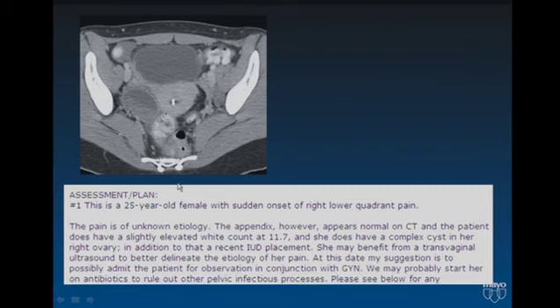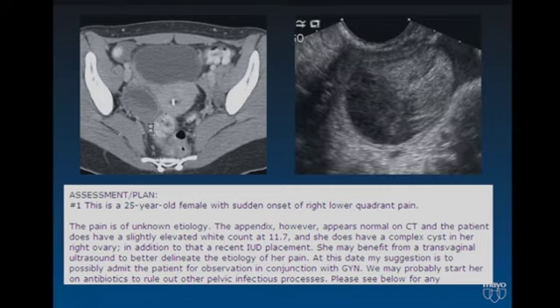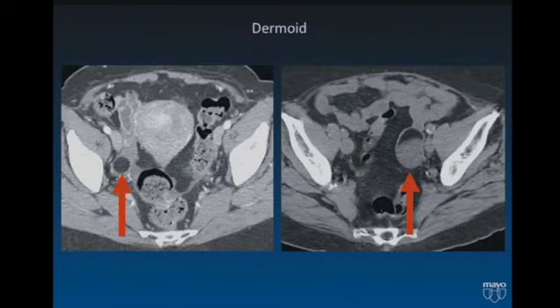And what I would like to emphasize in this lecture is that having identified something that looks like a hemorrhagic ovarian cyst on CT does not mean that you need to re-image with ultrasound to again show the same features of hemorrhage. This image is just as diagnostic as this image for a suspected acute hemorrhagic cyst. So that would be an example of a patient who might benefit from follow-up imaging, but certainly doesn't need re-imaging.